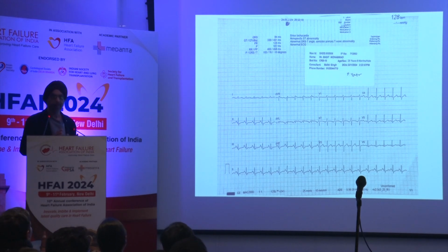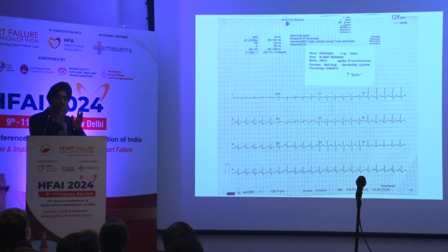There have been several examples where it looked similar to sinus tachycardia because it was arising close to the sinus node in the upper part of the crista. But there were clues on the ECG of a warming up sign or some other clues or a fixed rate. The rate doesn't change much. You may manipulate with drugs, the rate doesn't change much. There have been upper crista terminalis atrial tachycardias where we ablated and the patient's ejection fraction improved.